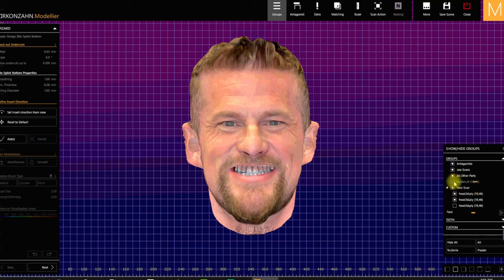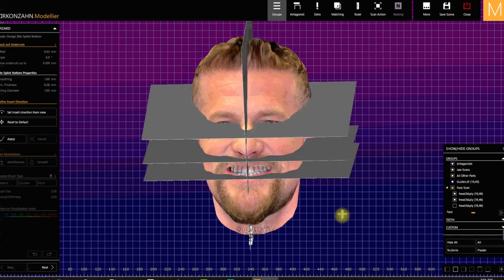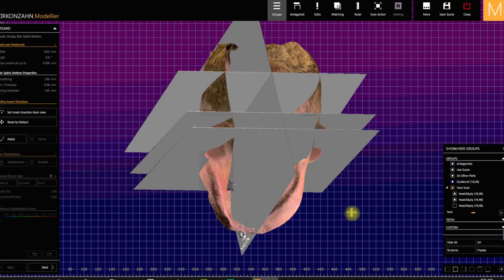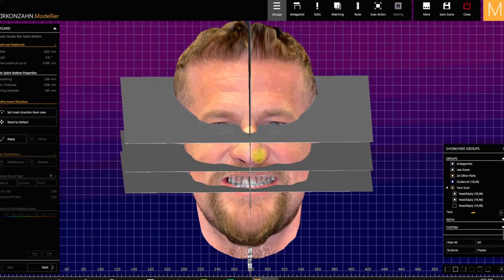You might want to have the guides there when you save it, so that Michelle has those to go off of. So anyway, that's how you do the face scans and line it up. So have at it. Let me know where you get stuck. The only way to get good at it is to keep on plowing through it. Let's end this little recording.